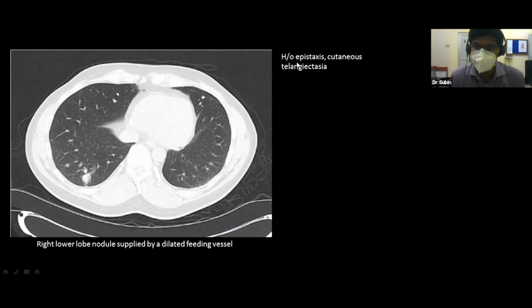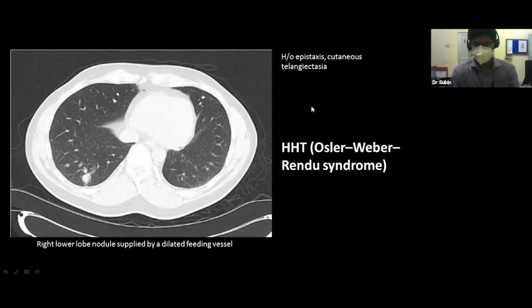I'll wait for some time if you want. So I told you AVM is there. The patient has a history of epistaxis. The patient also has cutaneous telangiectasia. Excellent. Very good. So that's Osler-Weber-Rendu syndrome, HHT. All right. Good.